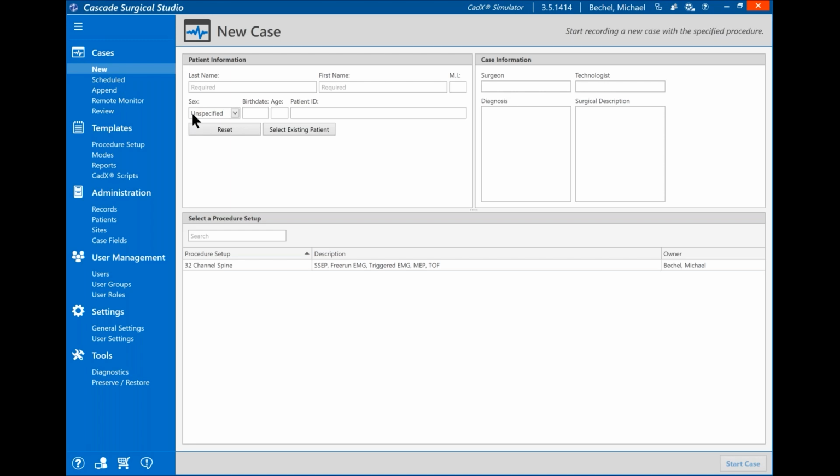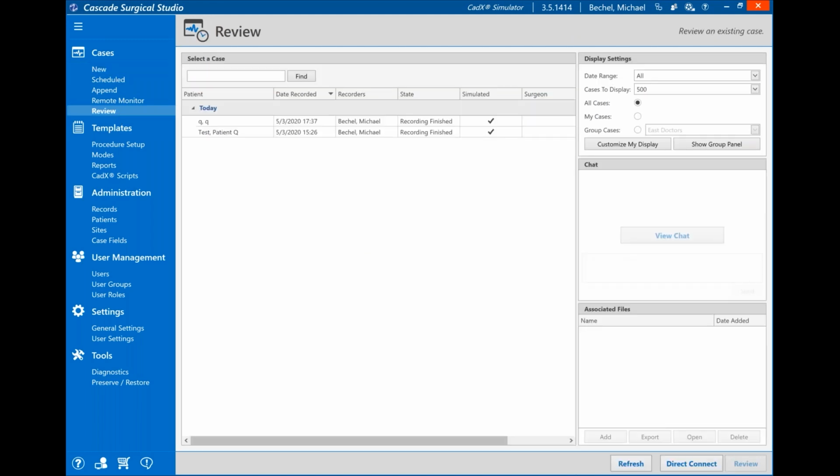And what this does for us is as we're recording data, it is actually connected to CADLink, and we know this because in our system tray, see if I can get it up here.